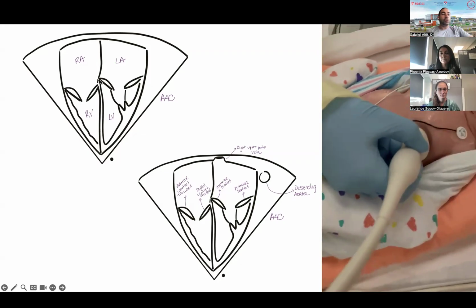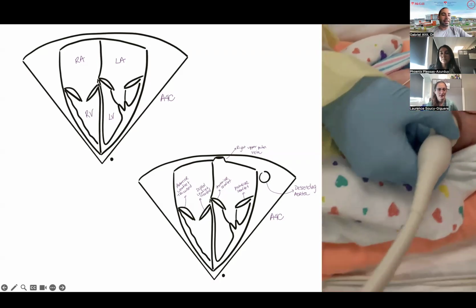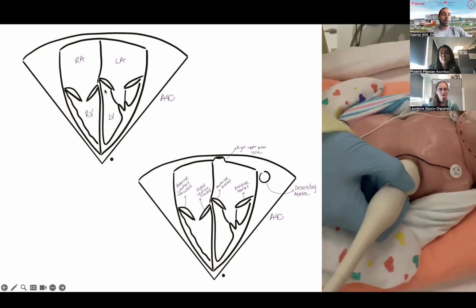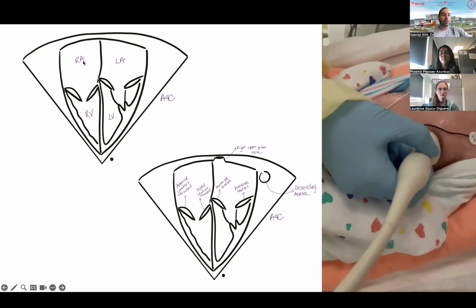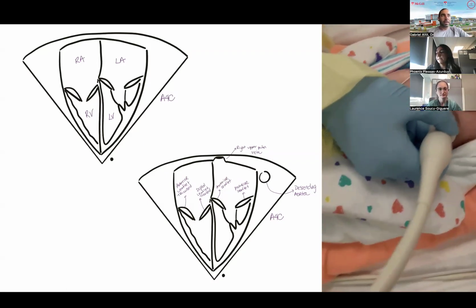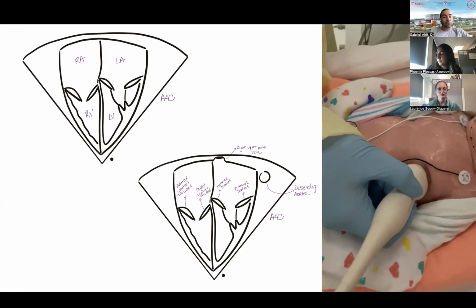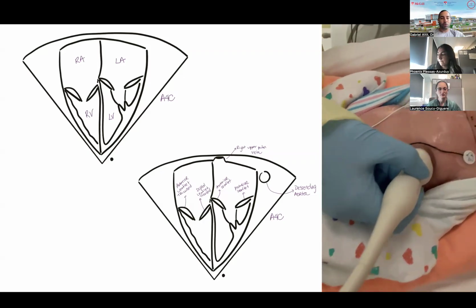And then you will always have an offset of this tricuspid valve, which is slightly more inferior, or sorry, downward, I should say, compared to the mitral valve. So you always have a portion of what we call the atrioventricular septum. And if you have a defect here, it's called a Gerbode defect, where you have a left ventricle to right atrial shunt, and the right atrium can be subjected to very high pressure and very high volume. So these patients can go into very rapid heart failure. They also get a lot of RA dilatation, so they can get a lot of arrhythmias because of that. They can develop clots in the right atrium because the RA becomes so dilated, and its contractility becomes a bit more impaired.